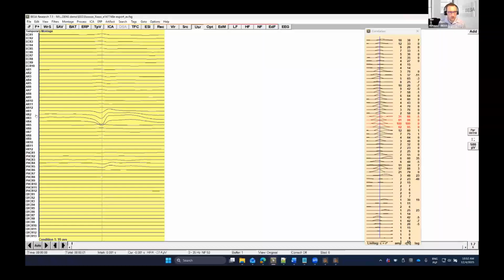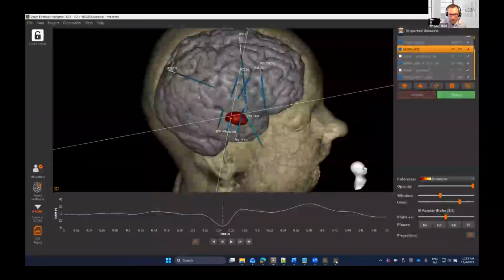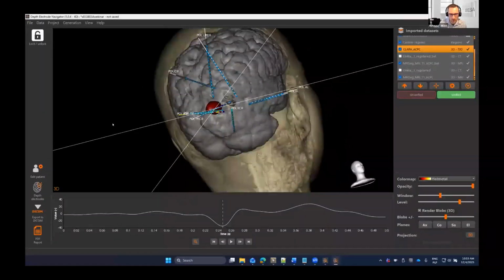And then you can see that the highest amplitude is automatically, we don't even need to select it, HR3, where it has this 100%. And then with the red colors, we have the related channels marked. And then you can see that the channel, actually number one, has the lag. So it shows 5 milliseconds beforehand. So it might be that this is the onset. And that's the most important one, even though it has the lowest signal, a lower signal than the others. And this we can utilize as well.